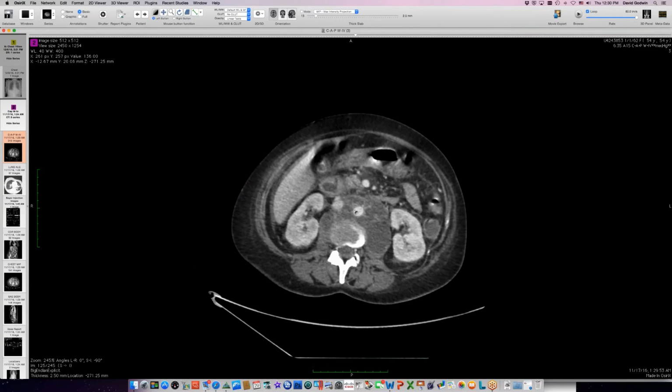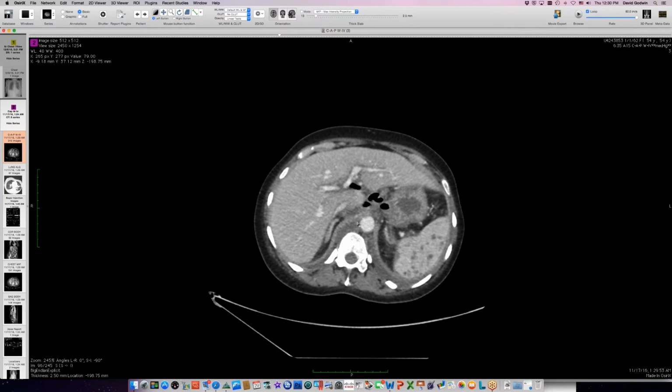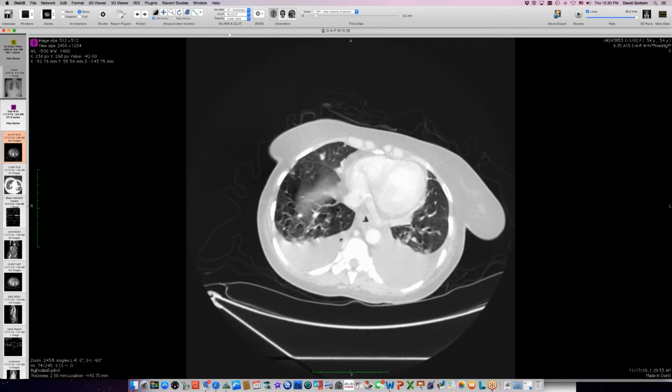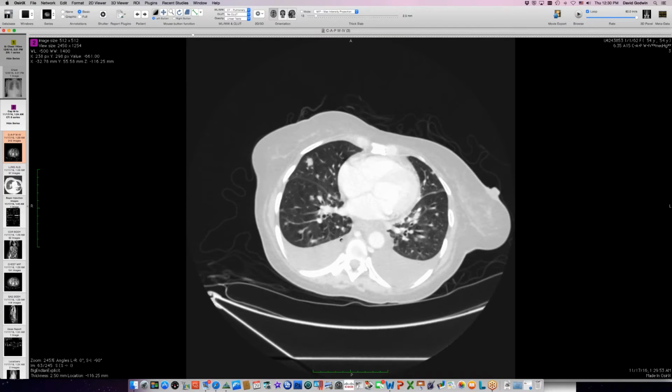So she's got this massive lymphadenopathy here, splenic lesions, and she had duodenitis that was biopsy proved to be tuberculosis. So she had some gastric obstruction. She was scoped, she had duodenal inflammation, biopsied, and it was TB of her duodenum, so she had TB all over the place. She also, I think, had meningeal TB eventually too. So widespread TB in an HIV positive African woman here. Like the old days.